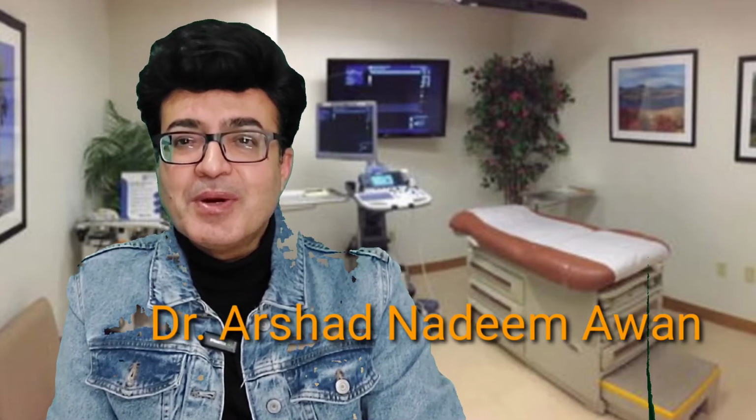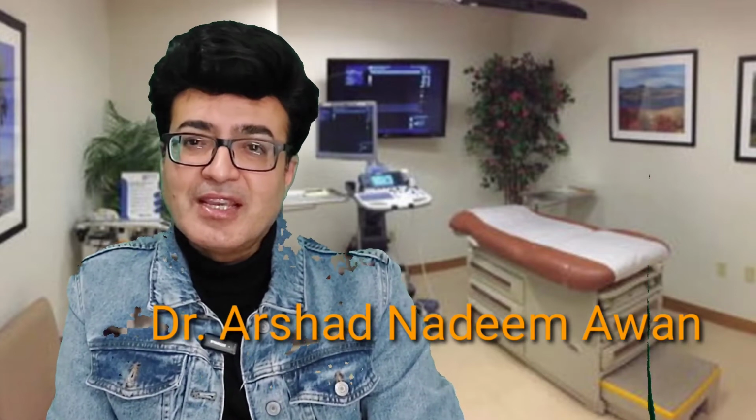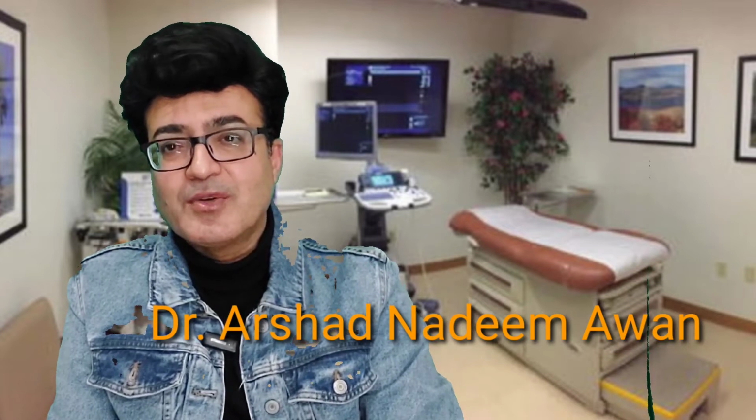Today I'm going to discuss liver infections and how they could appear on ultrasound images. In the last videos I mentioned that the liver hosts multiple pathological processes, ranging from congenital abnormalities to acquired benign and malignant tumors, and I will cover all these topics in separate videos. Today I will discuss liver infections and their presentation on ultrasound imaging. So let's start.